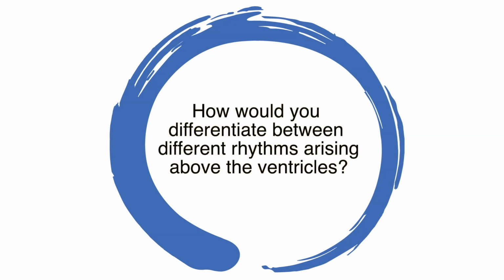In this session, we will be discussing the different rhythms that originate from above the level of the ventricles. There will be several EKGs, and when a new one shows up on the screen, to make the best use of your time, go ahead and pause the video, think about what the underlying rhythm is, and then play it.